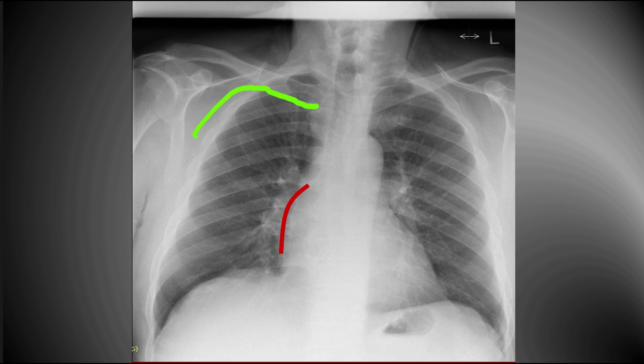This is a subclavian line that's going the wrong direction as well. In this case, the subclavian line is going up into the neck. This is not an uncommon scenario. The other place a subclavian line may go astray is that it may go straight across to the other side. In both of these situations, you need to withdraw the catheter and resite it.